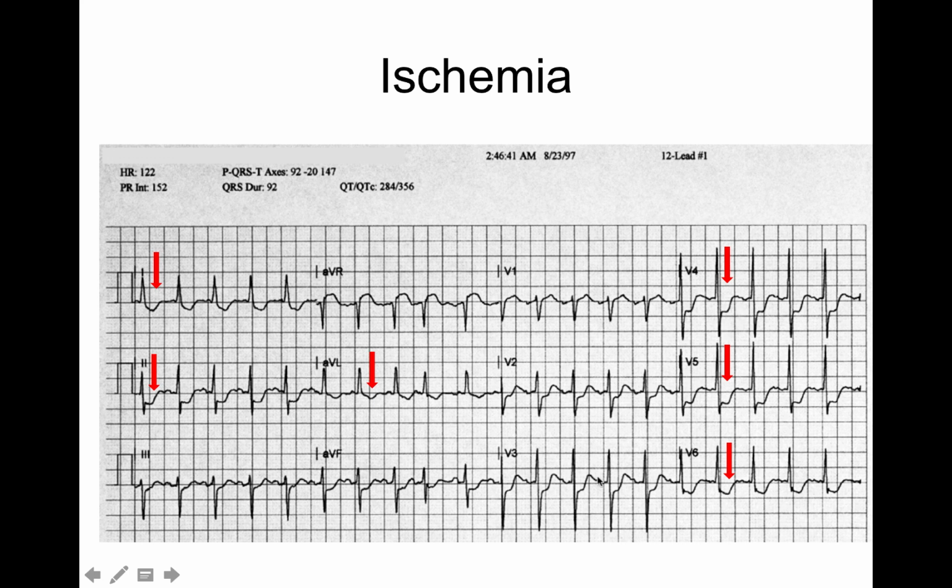Okay, but does this one match that one? No, it's a little progressed here, but I can't call it anterior fully. And then I see lateral right here. Boy, this looks very much like that one. So we have ischemia in the lateral portion of the heart.